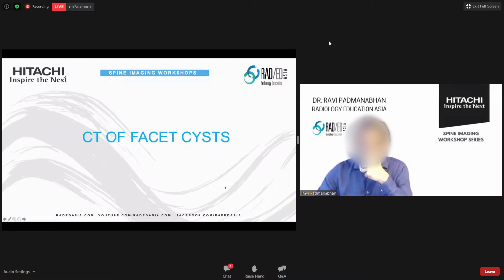Okay, what about CT? So CT is not as useful because the contrast of CT is the same. So the cyst will be the same as what's in the dura, in the thecal sac. So facet cysts are often missed on CT, but there are a couple of things that can help you, which are not common but can help.